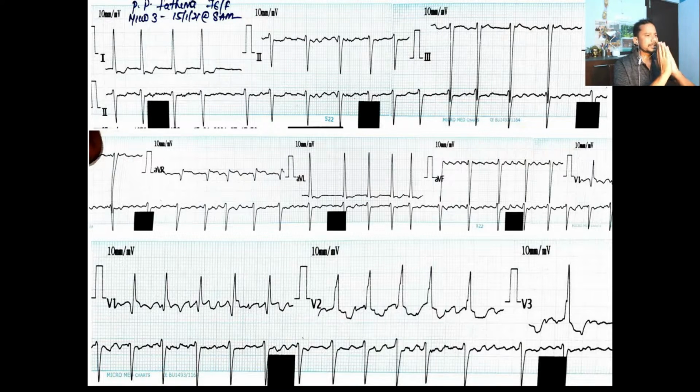So you see in this patient's ECG there is atrial fibrillation, irregular heart rate, and you cannot see the P waves. It is a wavy isoelectric line. That is very classical of atrial fibrillation. Right now we are just at the atrium level. Okay, there are a lot of findings in this ECG.